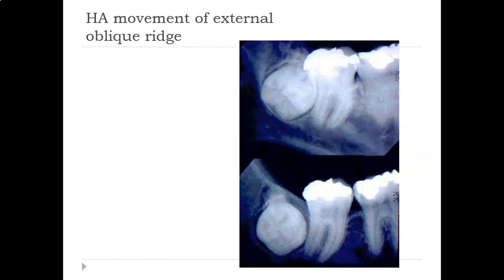Now that could take a second to wrap your mind around, I realize, but I'll just say it a different way. We know for sure that the direction that the ridge goes is the direction that the beam goes. So if the ridge went up and mesial, we know that the beam went up and mesial. And so we know those two things are constant. And so if the roots had gone more distal, then we'd say, oh, the roots are lingual, but the roots went mesial with the beam and with the ridge, so they must also be buccal.